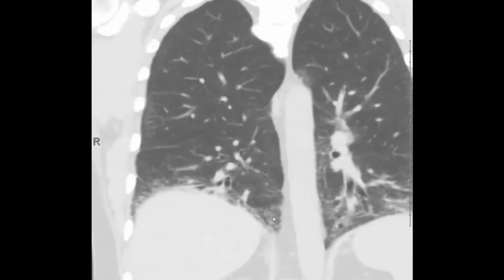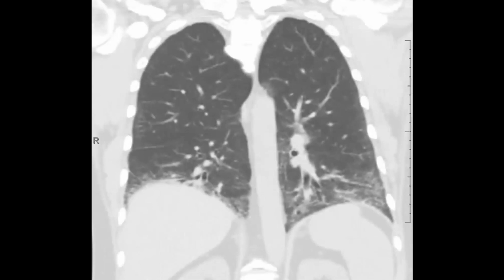Also, a nice example here of what we call the straight edge sign. So what do we mean by straight edge sign? It means with a straight line, you can demarcate where normal and abnormal lung is at the lung bases. And so we have published data that shows definitively, I think, that the straight edge sign is strongly associated with connective tissue disease. And so this is regardless of the underlying imaging pattern itself, whether it's actual UIP or NSIP, if it has that straight edge sign, there is a strong association with connective tissue disease.